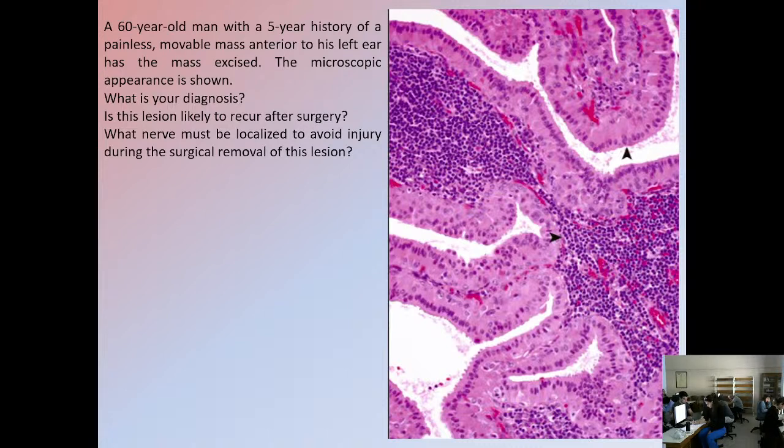And what do these cells and lymphoid tissue form? They form these stalks with vessels, capillaries, and increased lymphocytic presence. What is this architectural pattern that quite a lot of glandular neoplasms follow? What are these structures? They appear like fingers.